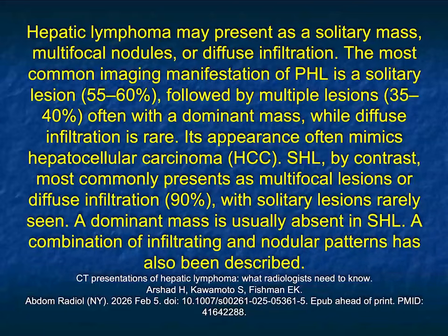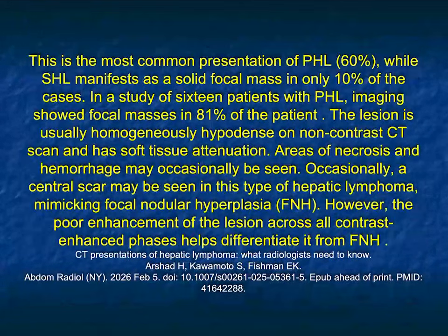As we mentioned, lymphoma of the liver, particularly when it's solid, large masses or multiple masses, can really mimic hepatoma or cholangiocarcinoma, but one thing that helps you is with hepatoma, the liver is often cirrhotic. That's not going to be the case with lymphoma. So that can be very, very helpful.